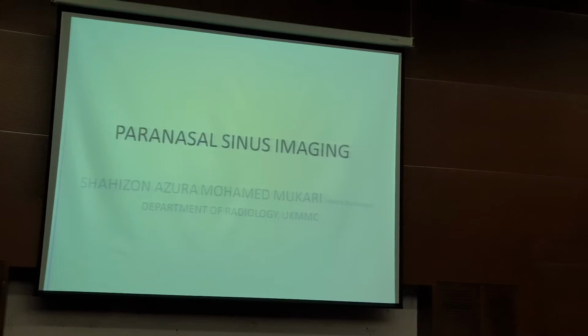What I'm going to do today is to share with you some aspects of imaging in the paranasal sinus. You're going to see a lot of black and white, a lot of CTs, and not so much MR, because when we deal with the paranasal sinus that contains a lot of air, usually the best imaging modality would probably be CT scan.